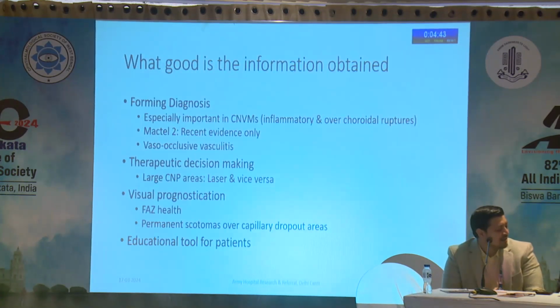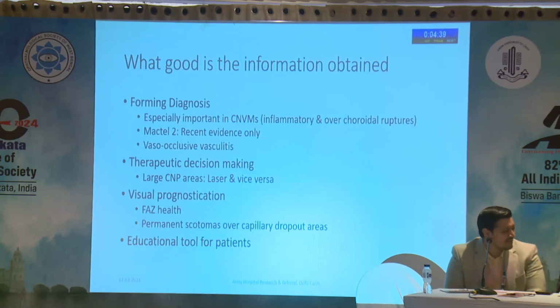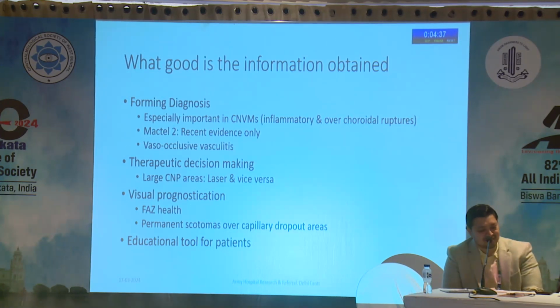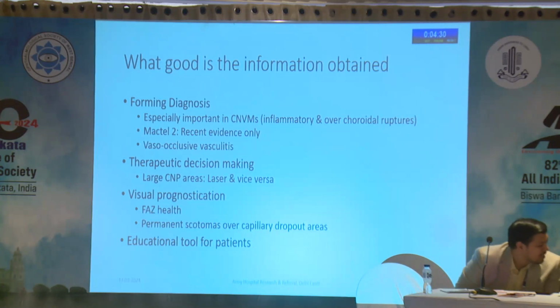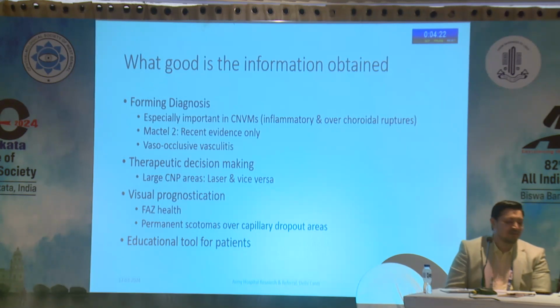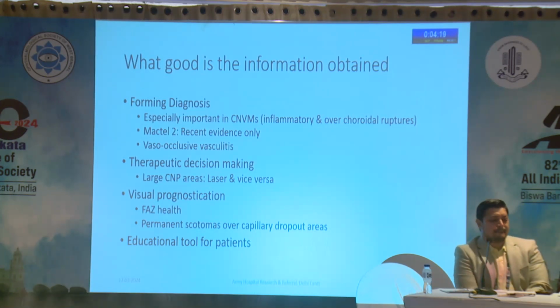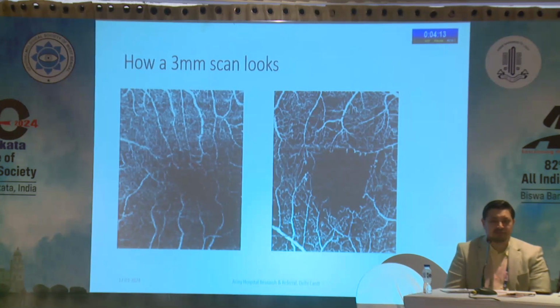Now coming to wide field OCTA. So wide field OCTA, it has come up recently. We were using OCTA initially only to diagnose foveal diseases, to say the best. But now we have taken it further to diagnose diseases which affect the mid-periphery. With the advent of the DREAM OCT, which has recently been launched, 130 degree of OCT angiography, probably we will be doing much more based on dye-less angiography in treating these diseases.